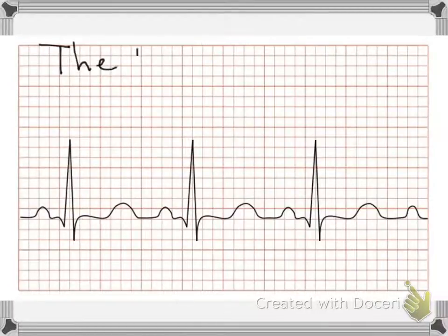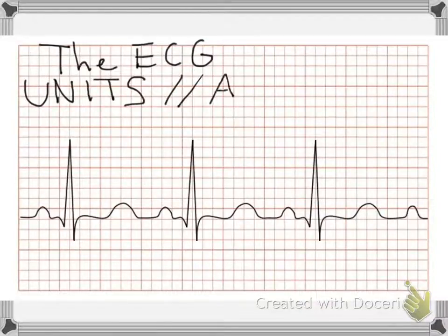So this first slide shows the electrocardiogram, which we affectionately refer to as the ECG. The ECG is recorded with electrodes at the surface of the skin, and we really need to pay attention to units. So I want to first describe the axis labels for a standard electrocardiogram. You won't always see these labels, but I think it will really help you to understand what's going on.